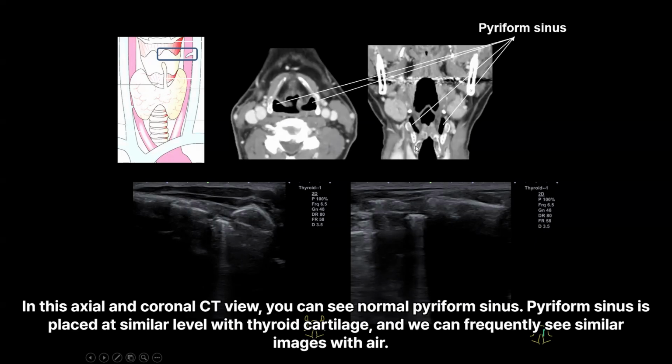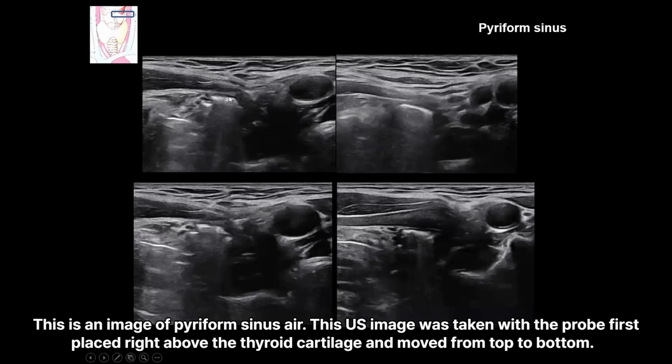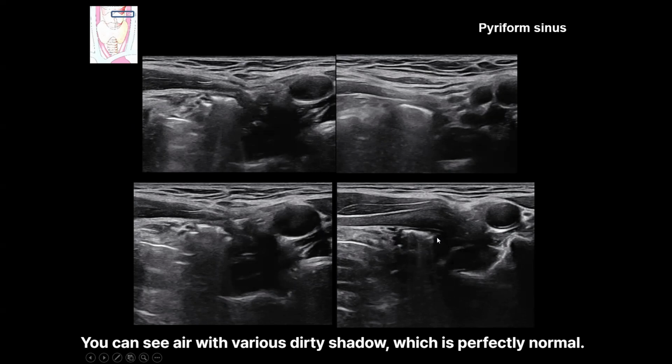In this axial and coronal CT view, you can see normal pyriform sinus. Pyriform sinus is placed at similar level with thyroid cartilage, and we can frequently see similar images with air. This is an image of pyriform sinus air. This US image was taken with the probe first placed right above the thyroid cartilage and moved from top to bottom. You can see air with various dirty shadow, which is perfectly normal.